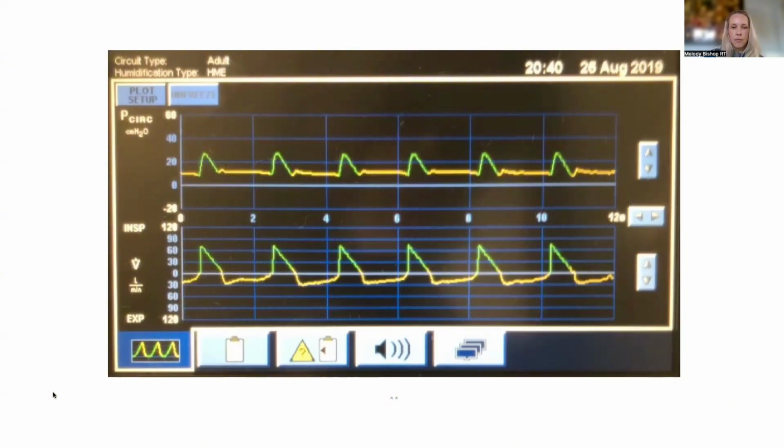And we have some interesting waveforms. So I think you could see the first one, right? Okay. So Melody, some of these are mine in air quotes, meaning that I've co-opted them from other places. Some of them are actually mine, meaning I took pictures, and some of them are yours. This one I co-opted from someone, so I don't know the specific situation. That's not even the point, I think. We don't need to know. You can almost think about the specific situation, what's happening, just off of the waveform. I think that's the next step for a lot of people, being able to identify what could be happening based off of the waveform analysis. Yeah. So what do you see here? What do you think about it?